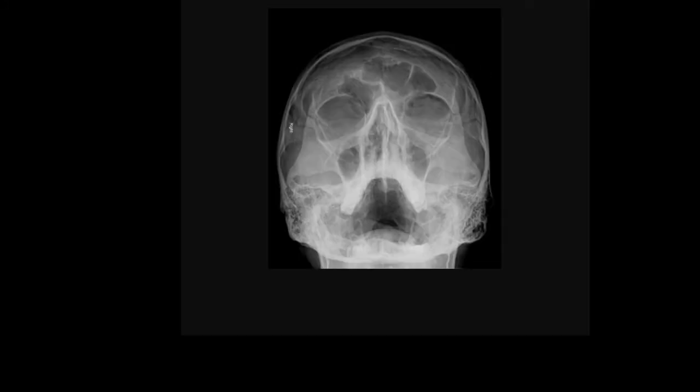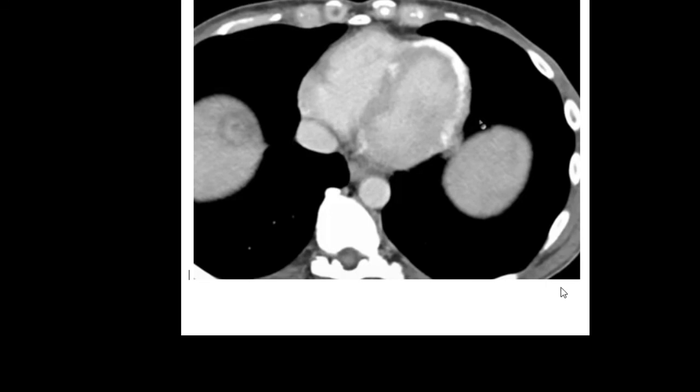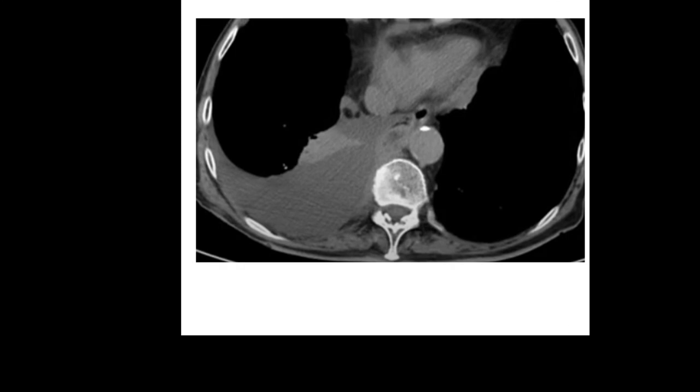A couple more quiz questions. Our first quiz question, so here you go. What is the diagnosis and what is the suspected history of this patient? Okay, and one more case. What is the source of the pleural effusion on the right?